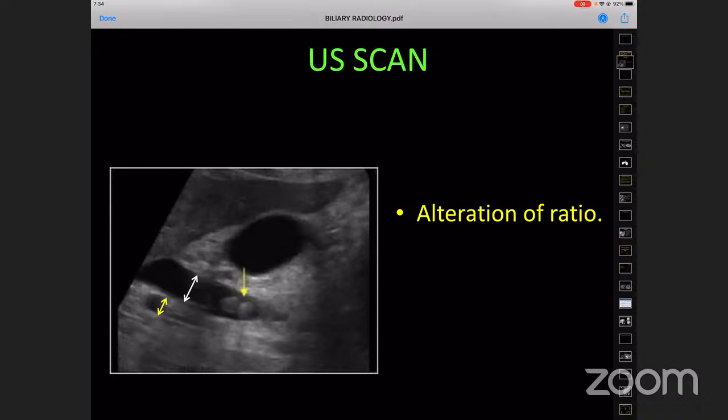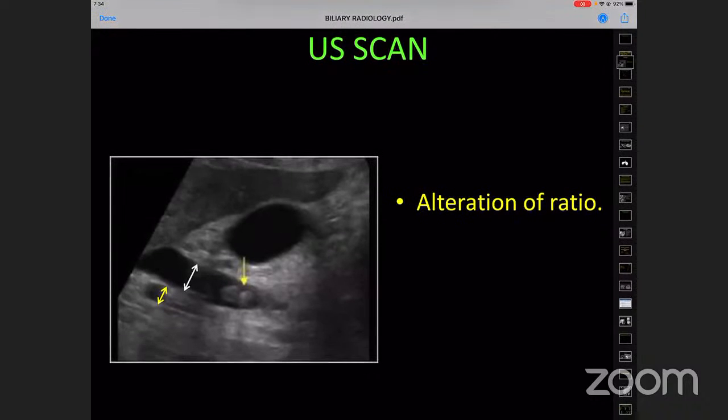So we see the gallbladder, and if it is a grossly distended gallbladder and nothing inside it, then according to Courvoisier's law, we start thinking something bad is stuck in the distal CBD or somewhere. And if the gallbladder is a chronic cholecystitic gallbladder, with irregular wall thickening and a few calculi inside the gallbladder lumen, then we think there should probably be something in the CBD, because the IHBRs are dilated.